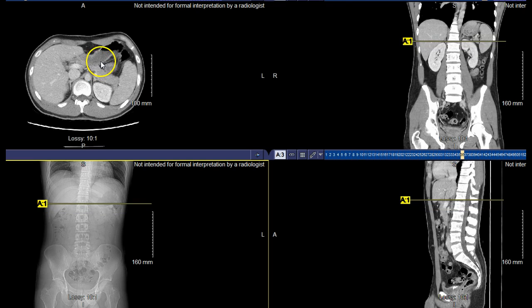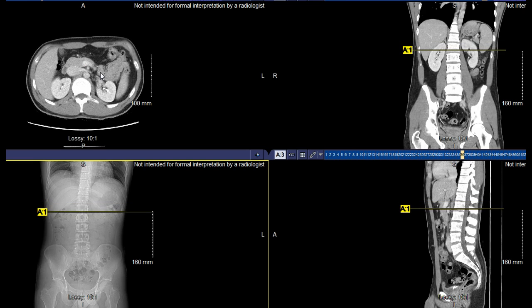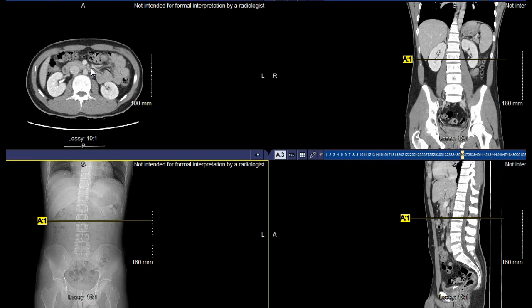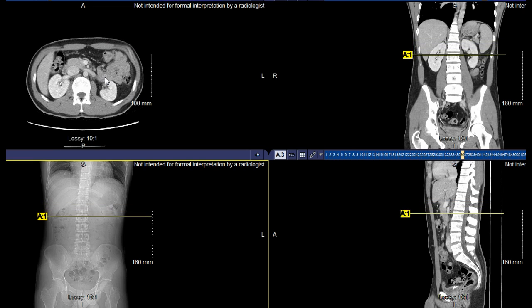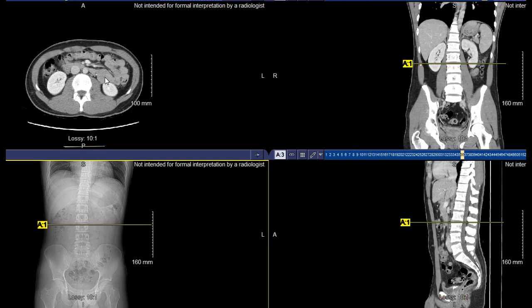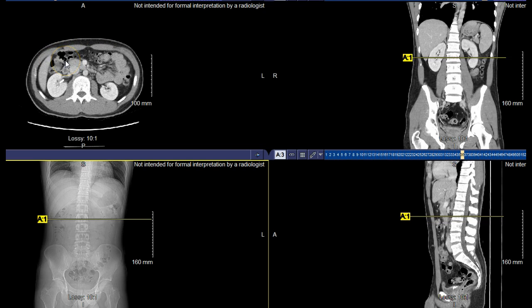So kind of going through, you can see that transition point right in through here where the duodenum would be, the pancreas would be, then respectively here, here, and so on and so forth, kind of going through that region. So you can see the area of the pancreas really well, kind of right through this region. So stomach, pancreas we can see, but really to truly focus on some of these other bowel-based structures, not great. You can see the large intestine. You can kind of see what that structure looks like. You can see those haustral markings associated with the large intestine.